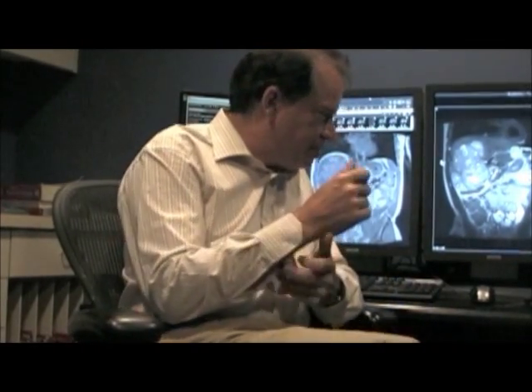Now, many of you will have read my textbooks, you probably will have seen some of my publications and also presentations, but in all of those settings, you'll only see 4 images from any particular case. Body MR, as you know, oftentimes has anywhere from 600 to 1400 images, and I'm going to show you how I go from those 600 to 1400 images to make a diagnosis, and in selected cases, the way I would set up a teaching file. So let's roll up our sleeves and begin.